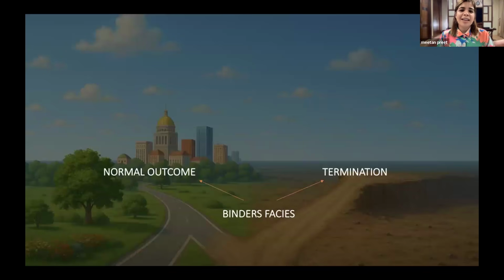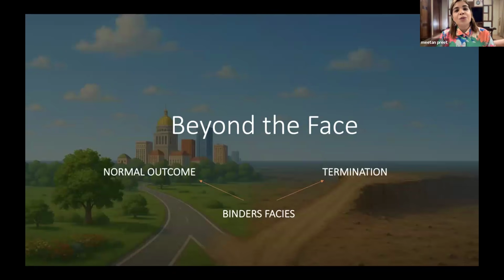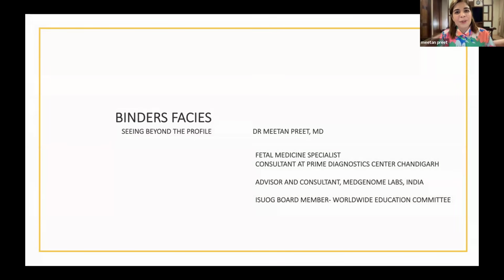Binder's facies, one single diagnosis. One patient chose a normal outcome, the other one chose termination. Why so? Because we chose to look beyond the face. Hence my topic of the day, looking beyond the profile when we are seeing Binder's facies.